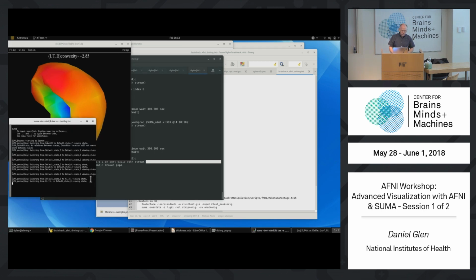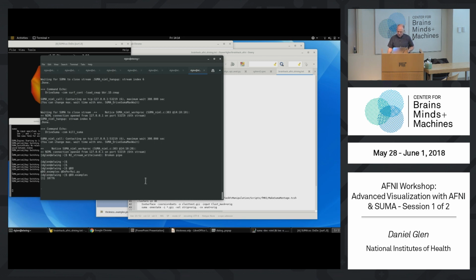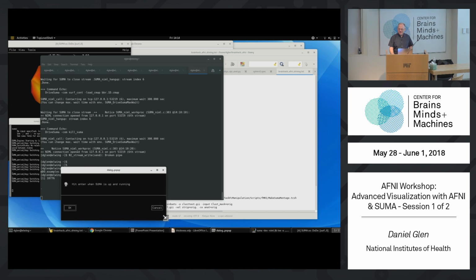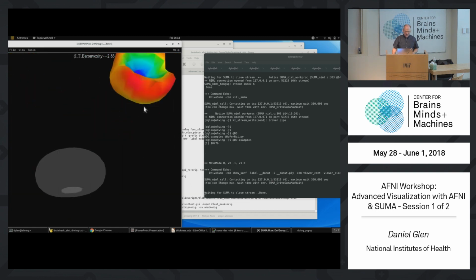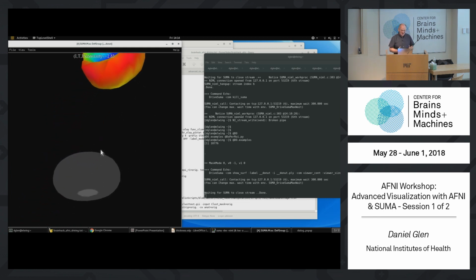Okay, and in the terminal that it opens up, I think you can just... No, it's got a problem. No, okay, so here, I think it's got the same issue. So, well, that's annoying, so we'll skip that. Yeah, if you look, there's a hidden prompt in there. Yeah, I get that. You get that prompt? Yeah. Okay.